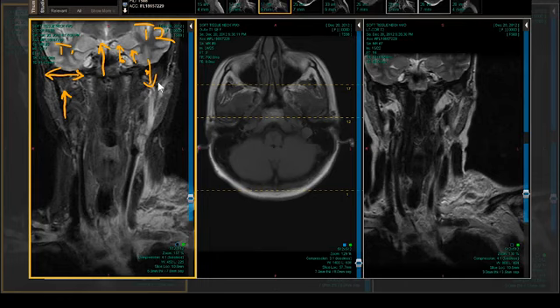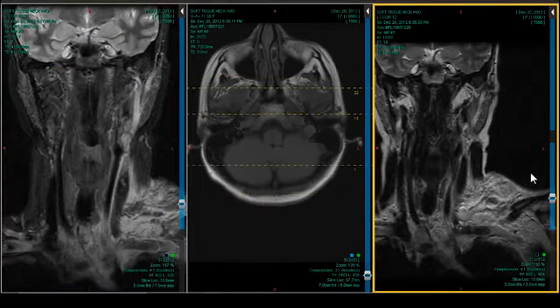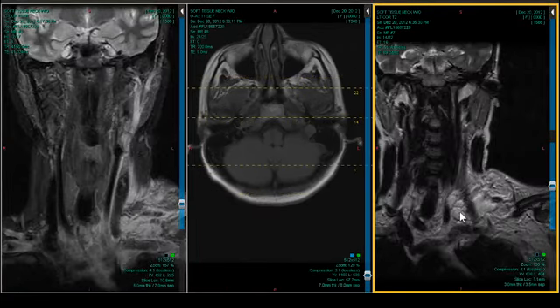That should never happen. So distension of the vessel, swelling of the vessel, edema of the soft tissues, gray on T1, bright on T2, but without any flow effects. It's very homogeneous. Look how bright it is. And you don't see any wispy flow effects, nor do you see smearing in the phase-encoded direction because there's no motion. So the absence of pulsation artifact is helpful. It's a sign that it's thrombosed.